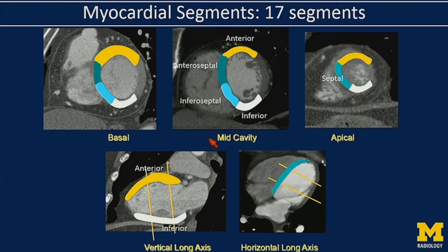So where do we see it? This is easy to guess. You can see the septal wall nicely on a four-chamber image. And the same thing applies for the lateral wall. Again, we have these two segments, an anterolateral segment and an inferolateral segment. At the apical level, we have a single lateral segment, again nicely seen on a four-chamber image.